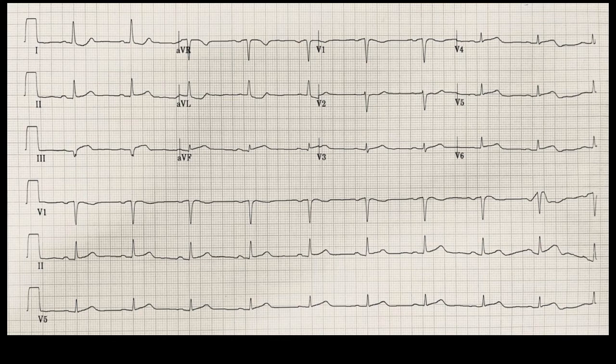Let's see if we can find anything else. When we look at lead 2, here it is again. Depending on which TP segment you look at, maybe not actually elevated, but it certainly has the appearance of it. Not sold on that one thus far. I look down at lead 3, this guy here, and boom, that's got it. So here's the ST segment right where the cursor is. Is it up a millimeter from the intervening TP segment, this baseline? It sure looks like it is, and it's got that tombstone-y kind of appearance. So that's concerning for ST elevation.